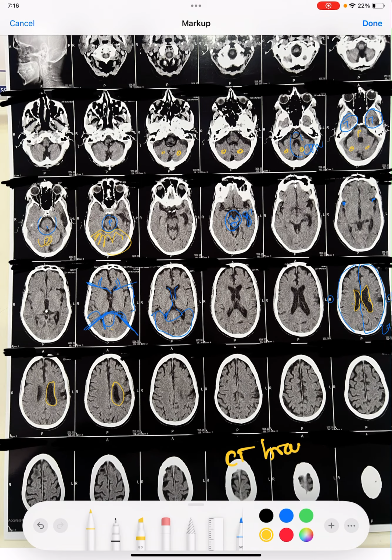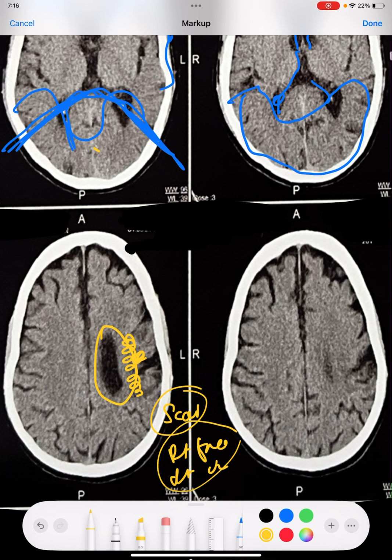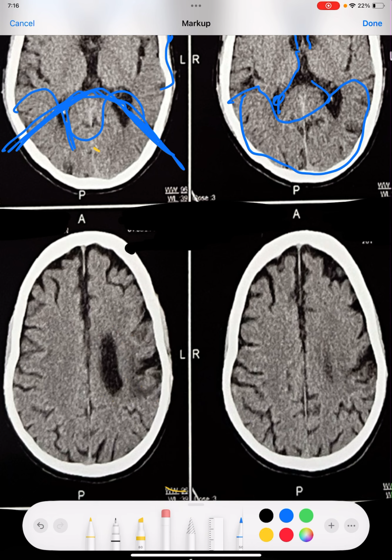When we know the brain is damaged there, it definitely means there is a scar here. If such patients present with typical focal convulsions, as this is left-sided brain parenchyma and the patient presented with right-sided face and right-sided upper limb convulsions, this totally fits a left brain lesion. Convulsions with an old damage favor scar epilepsy.